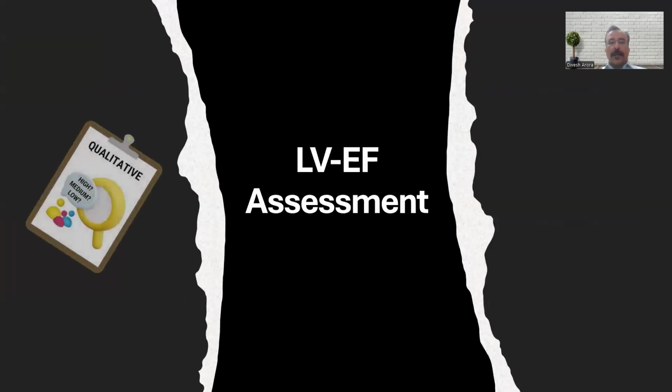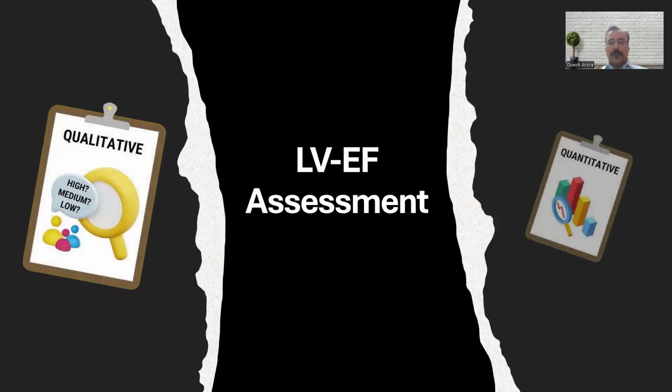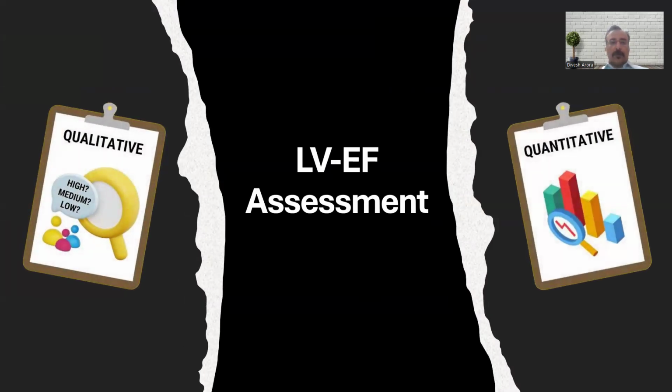So, how do we actually assess left ventricle? There are two important methodologies. One is the qualitative assessment, another is a quantitative assessment. In subsequent slides, step by step, I'll take you through the qualitative as well as quantitative methods of assessment of left ventricular ejection fraction.